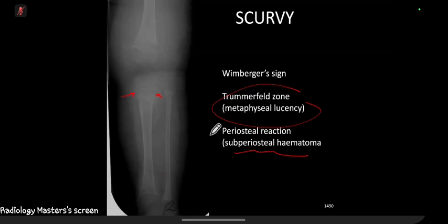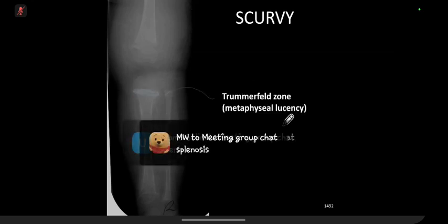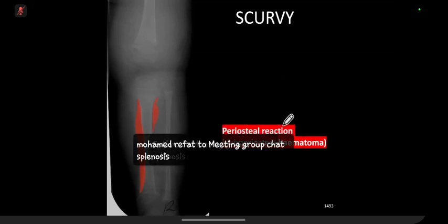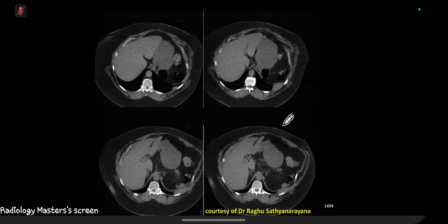Okay, this patient was involved in a road traffic accident 10 years previously. You can see that there is no spleen, but there are splenunculi here, here, and there's something in the pleura above the diaphragm, and that is thoracic splenosis.